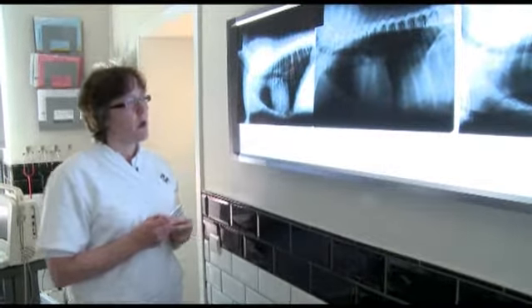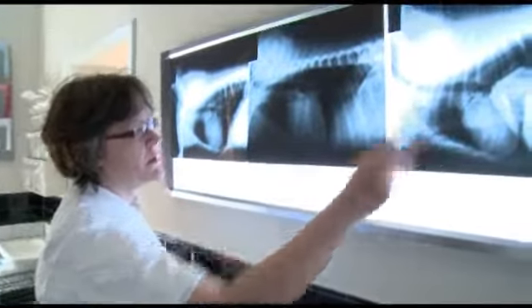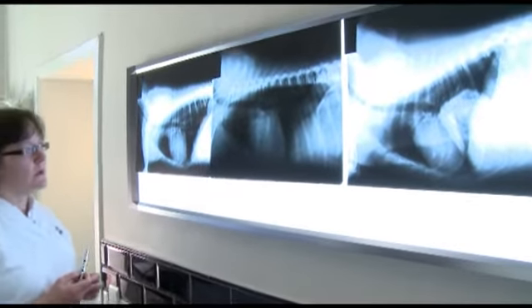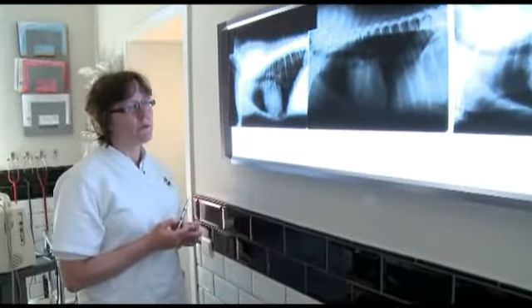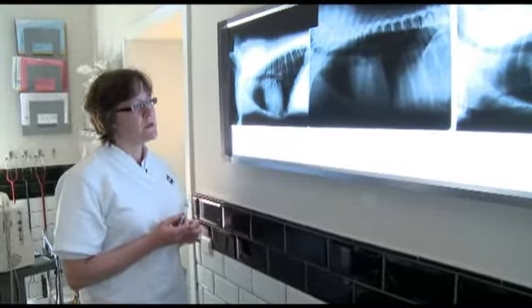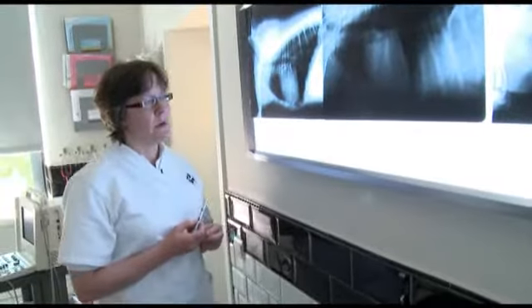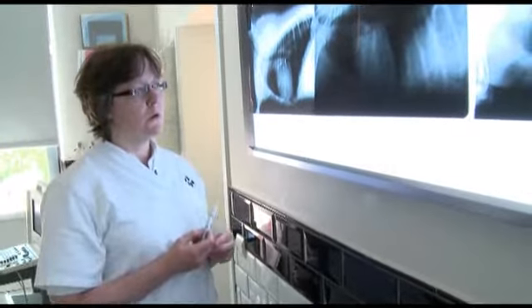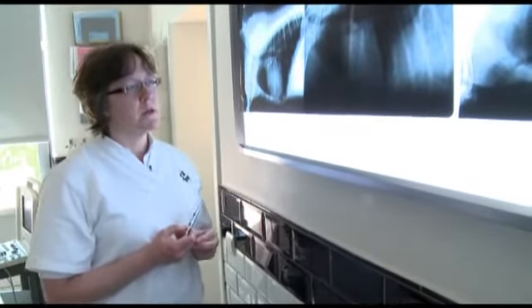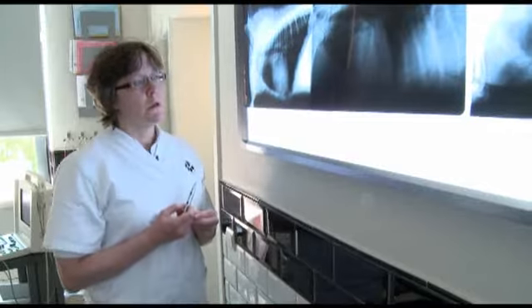Pathological patterns are bronchial patterns, alveolar patterns, soft tissue patterns, mineralized densities in the chest cavity, and interstitial patterns. However, we have to be very careful with over-interpreting interstitial patterns, because just the fact that the radiograph is taken in an expiratory phase can give you an interstitial pattern.